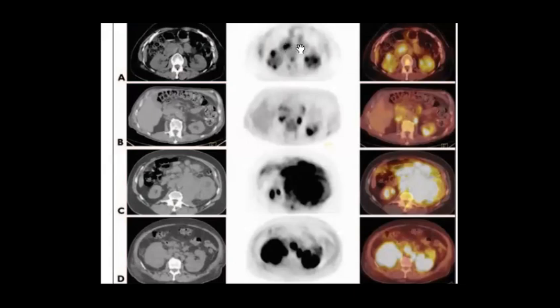So it is retroperitoneal lymphadenopathy. Yes, and the IVC maybe is compressed, but lymphoma doesn't involve the IVC itself. It's not typical to go inside the IVC. It's just compression or displacing.